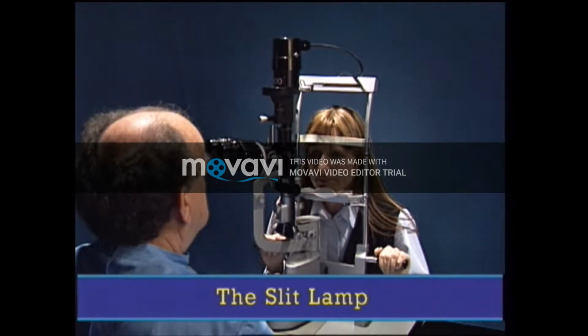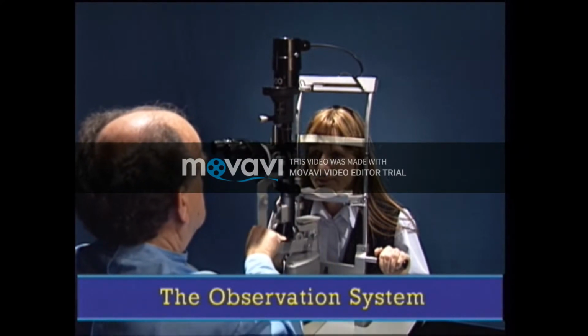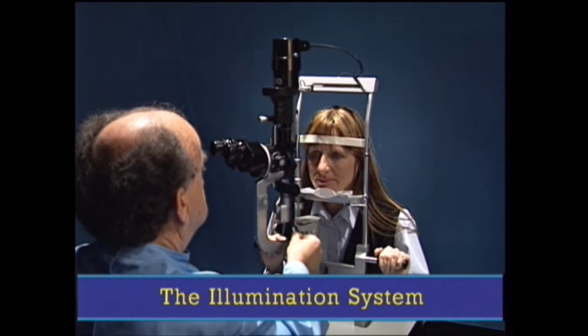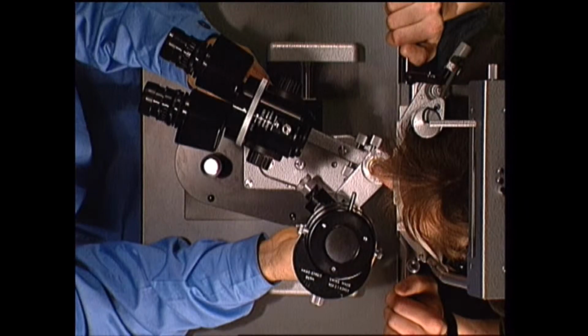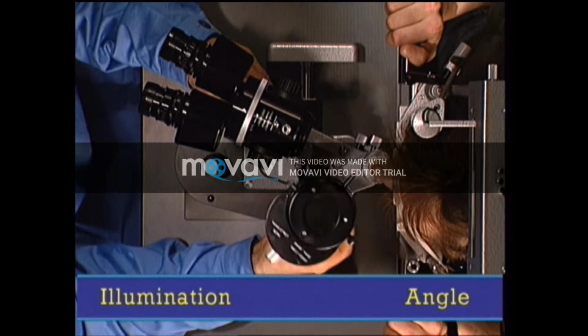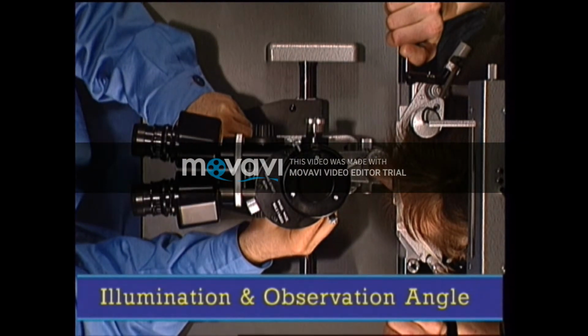The design of a slit lamp provides such a tool. The slit lamp has a moving observation system, the microscope, and a moving illumination system, the slit beam. The actions which are used for generating the optical phenomena can be described by two angles, the illumination angle and the observation angle. Let us describe first the illumination angle.